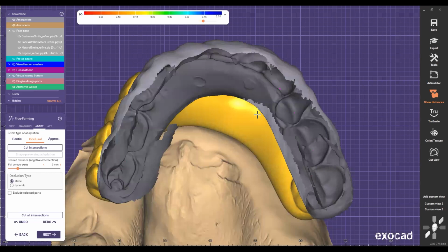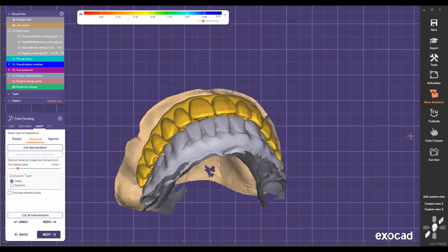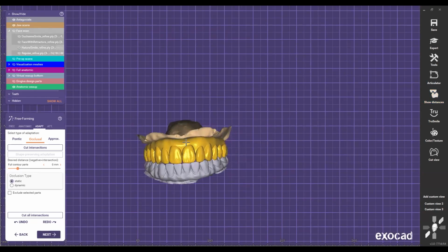Make sure when you put the supports, if you're printing, that you remove the supports properly. Use loops, get the handpiece, and just grind where the supports are. Don't grind too much and don't polish too much, otherwise you're going to get rid of the contacts. If you're milling, that's not a problem. Just don't put too much glaze, just a thin glaze layer there, and that way you preserve the contact points, okay?